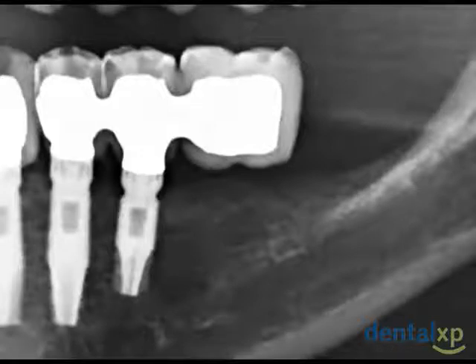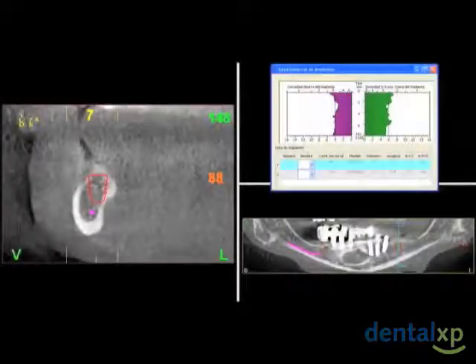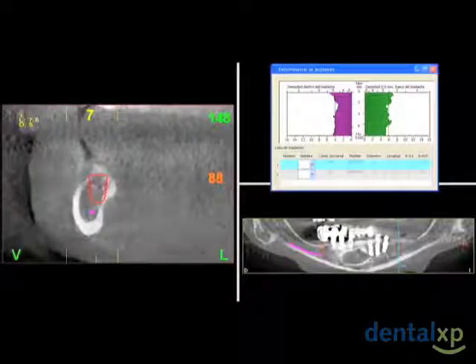We can have a case like the one we are seeing, in which the patient had an implant restoration with a cantilever distal ending on the restoration. A radiographic BTI scan was performed, and we can see very clearly that if we want to place implants on the distal area of these restorations, we need an implant with a length of 7 or 7.5 millimeters with a diameter of 5 or 6 millimeters.